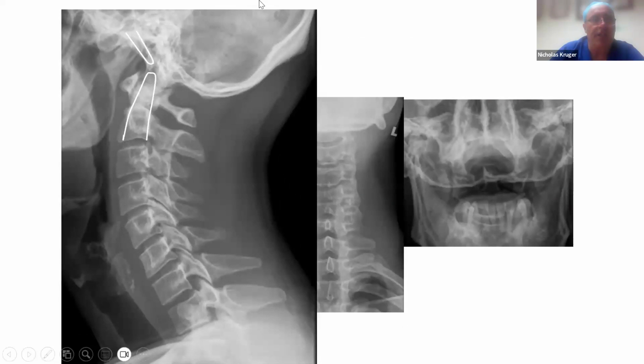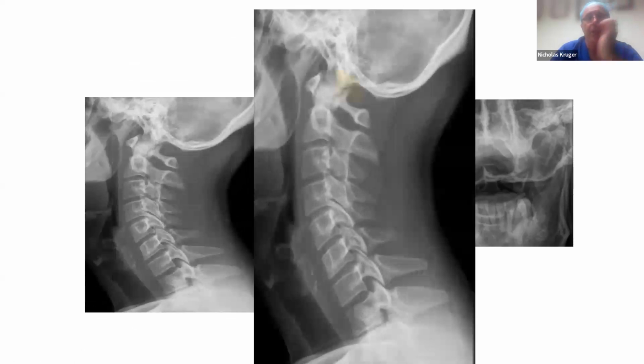Sorry, obviously this line is, if this gap's big, then you're worrying about a cranio-cervical dissociation. You can also see the condyle sitting nicely in the sulcus in the C1 arch. That's also a giveaway if you find there's asymmetry in this joint, the C0, C1 joint, then it means that's subluxation, and it's usually because of a cranio-occipital dissociation. That's showing where the cord goes.